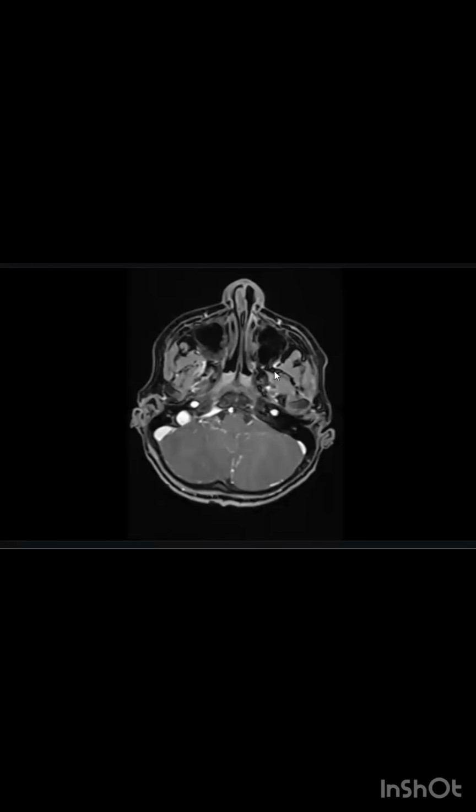Which territory will this infarction take? Usually, as it is involving much of the posterior cerebellar surface, posterior inferior cerebellar artery infarcts usually follow this territory, the whole cerebellar hemisphere. Okay, I will give you the contrast. Give me your final diagnosis, please.